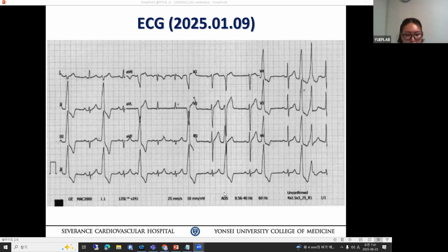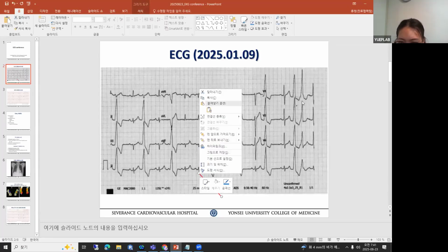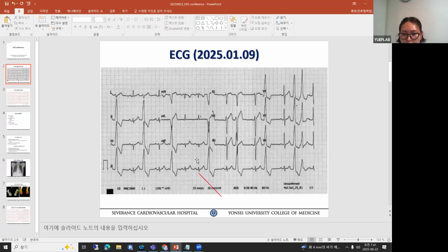Use the caliper. You're talking about this one to this. Yes. Okay, measure that. Isn't that the same as this? So you measure this PP to this PP. This guy to this guy. Let me see. Yeah. Okay.